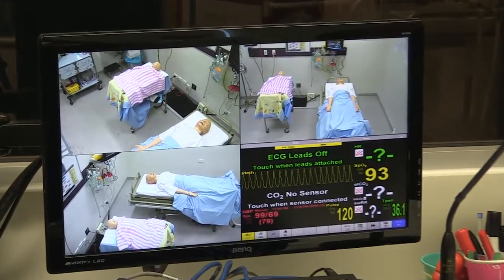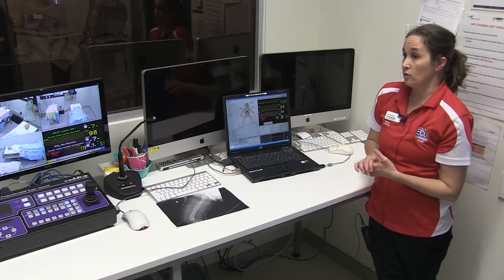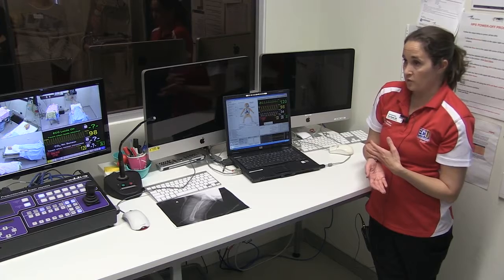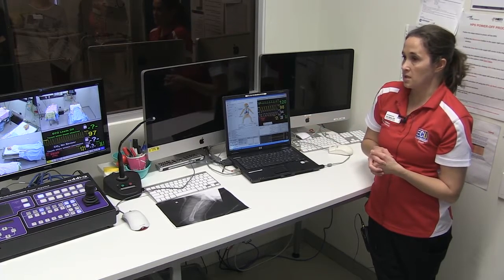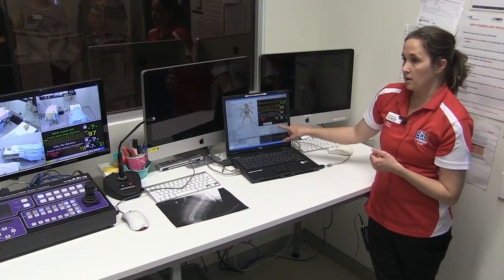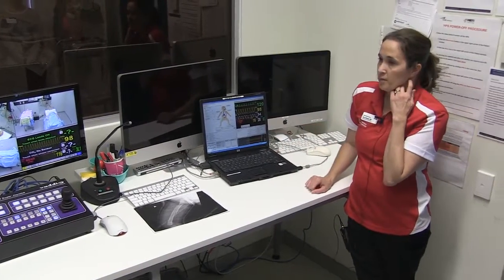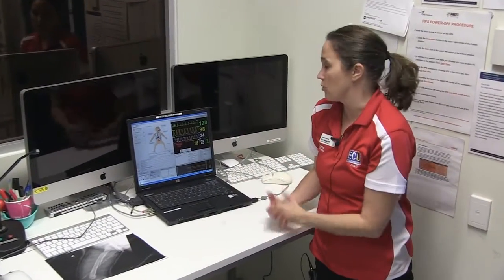It only makes a difference when you're setting the scenario, and if you accidentally hit the blood pressure and you don't mean to, and you want them to actually initiate the blood pressure, you don't want a blood pressure on the screen already, then you need to restart this program. That's the easiest workaround, because all of the others you can check and uncheck and give them feedback or non-feedback, but the blood pressure is just going to engage it. Every time you check it, it'll just engage it. It won't turn it on or off.